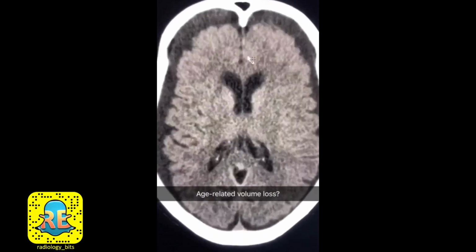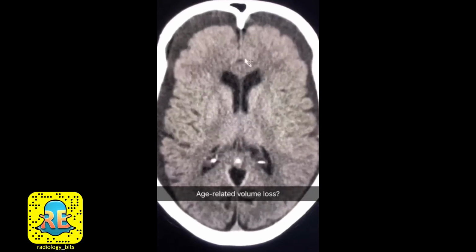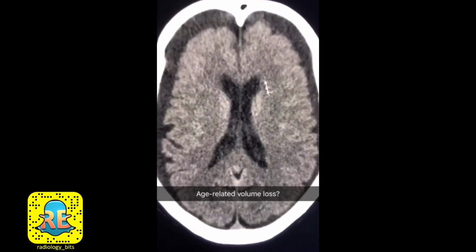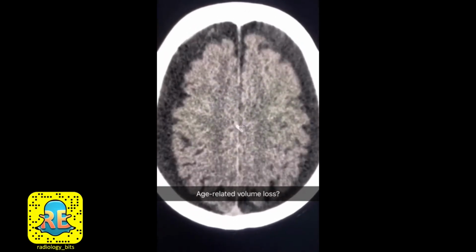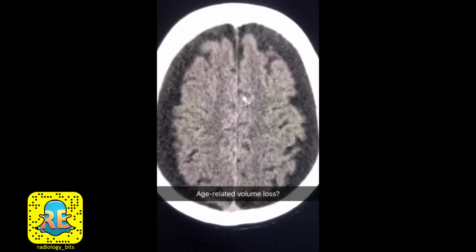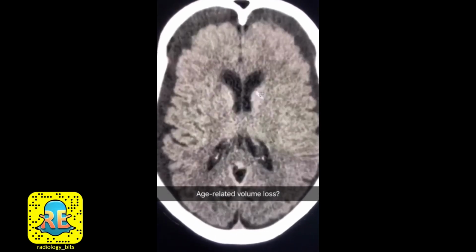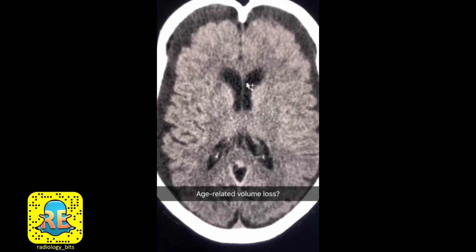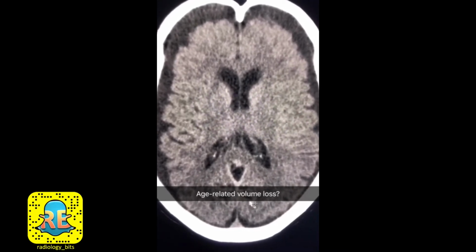One of the major differences between brains in the young population versus those of elderly patients is that the brain loses volume as age progresses. So with that, you notice that you have less brain parenchyma with more prominence of the CSF spaces, being the ventricles, sulci, or the CSF surrounding the brain peripherally.